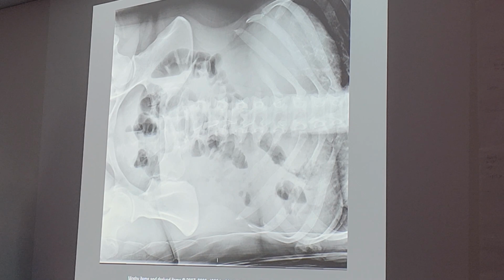Let's evaluate this image. Okay, so it is a decubitus because there's a sheet. It's a left decubitus position, because the right side's marked. We always mark the side up. And also you can see the sheet, an artifact. There's an artifact. The left ilium is foreshortened. Left ilium is foreshortened. Rotation is occurring.